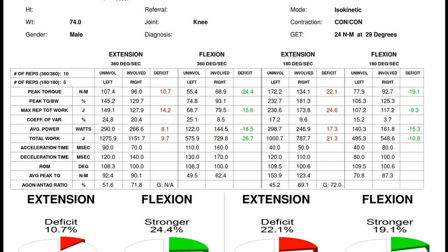So the peak torque will usually occur in the 4th set or around there. I would stake my money on that being the issue. So I would assume this to be a lack of familiarization.